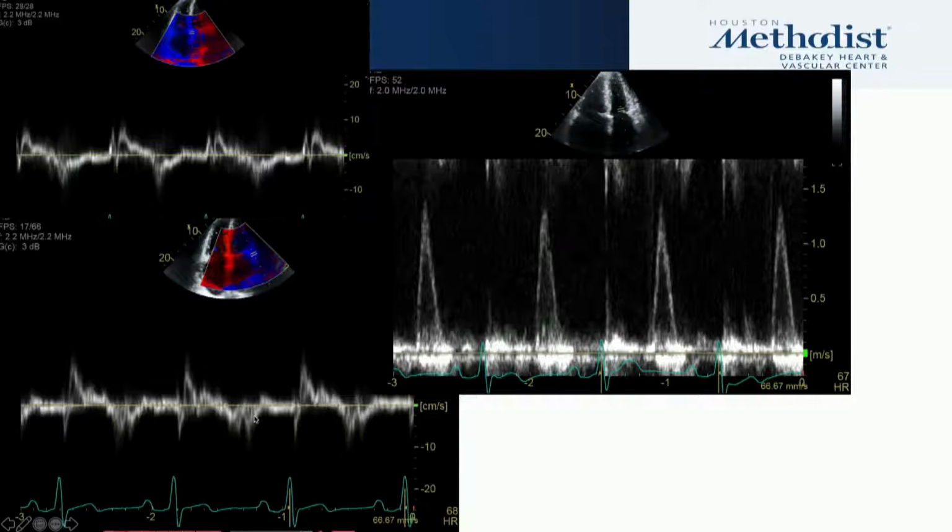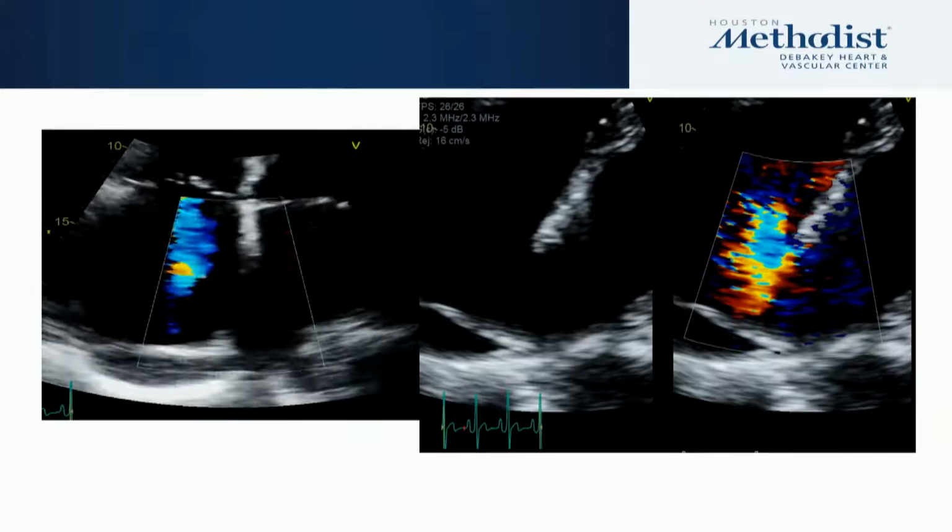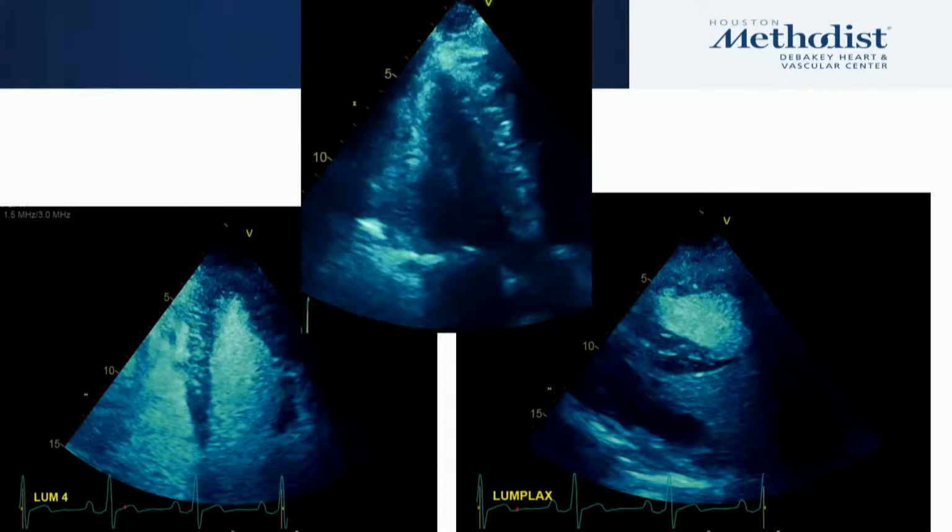So now we're talking about an advanced diastolic dysfunction, grade 3. It's hard to say specifically, but grade 3 in that regard. And then the interatrial septum, that is basically showing, again, another picture of the color Doppler.